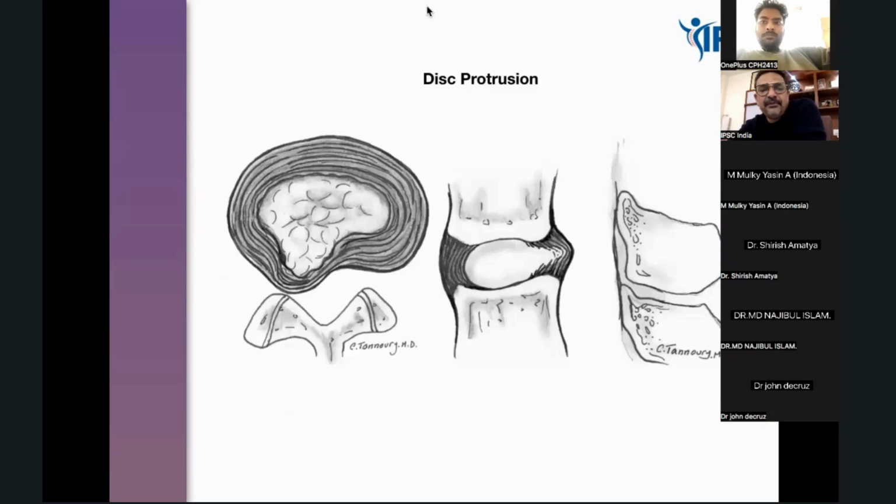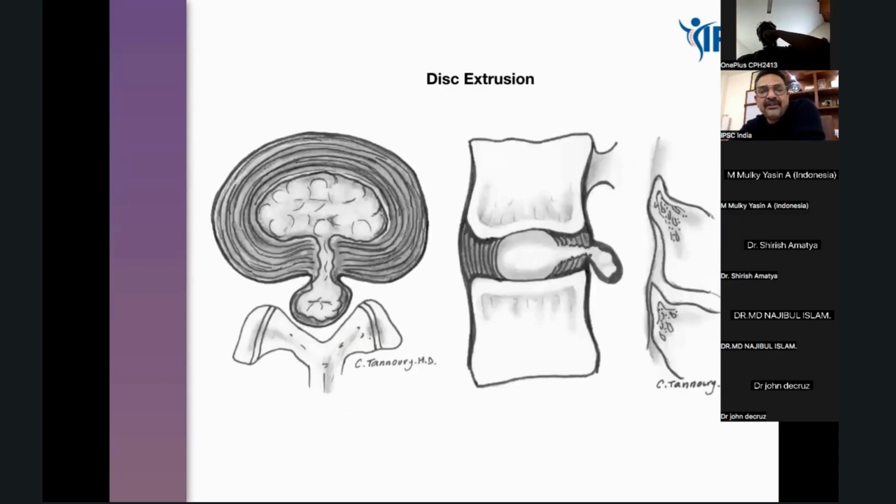If you have a protrusion, where the ligament of your annulus is intact, we should avoid the outside-in technique, where we go into the canal and start decompressing from there, because the annulus is intact. We want to preserve this annulus in these cases. It is better to go inside and decompress from there. If you have an extrusion like this, these are the good cases where we can directly target the fragment with outside-in techniques.